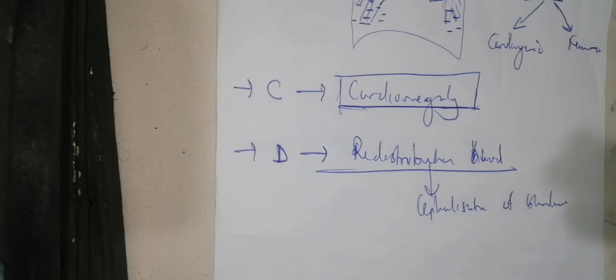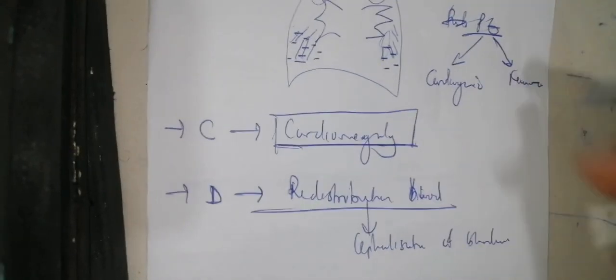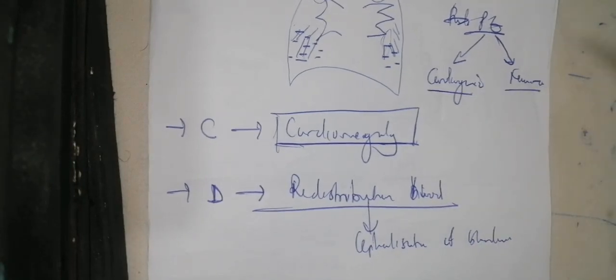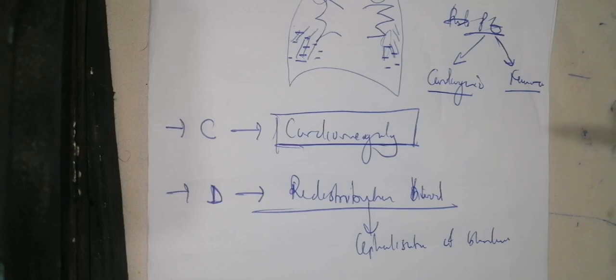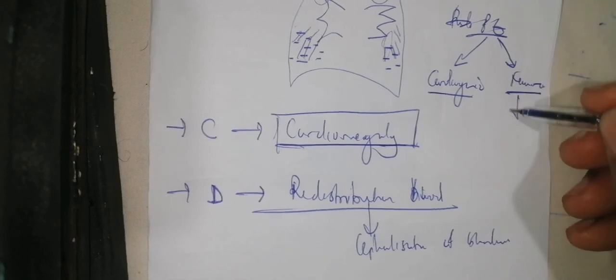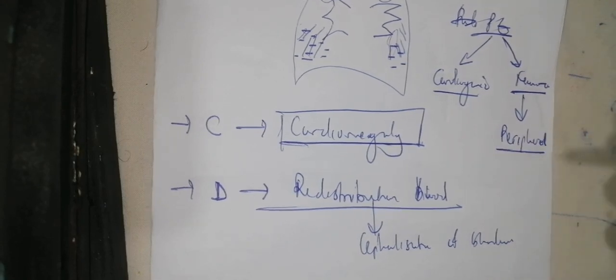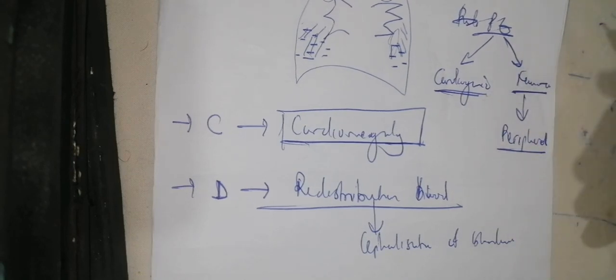And all this is when you are seeing the lung field in B, that is breathing. So now you need to know that pulmonary edema, as we said, is divided into cardiogenic and non-cardiogenic. For non-cardiogenic pulmonary edema, you're going to have the A, that's alveolar opacity. You're going to have the B, that's the Kerley line. But you need to know that generally in non-cardiogenic, the lesions are more peripheral in the lung field than central. While in cardiogenic pulmonary edema, the lesions are more central than peripheral.